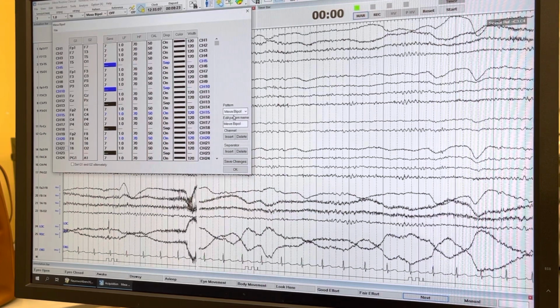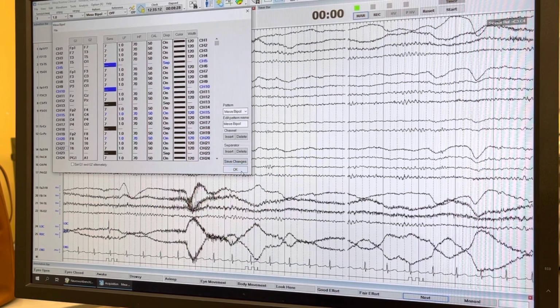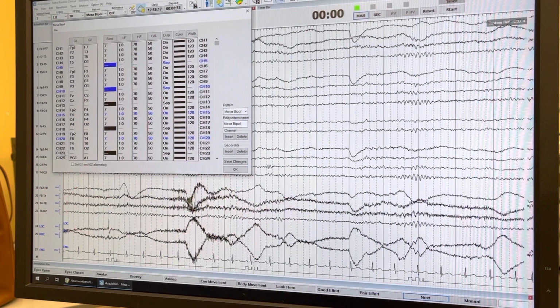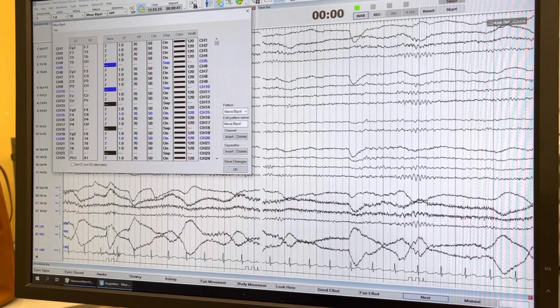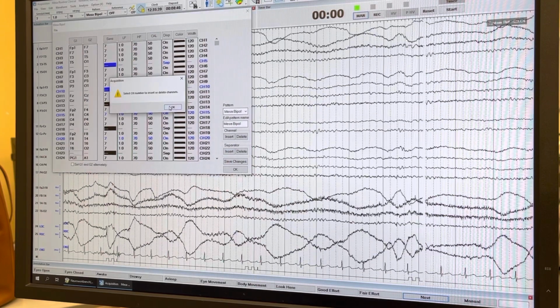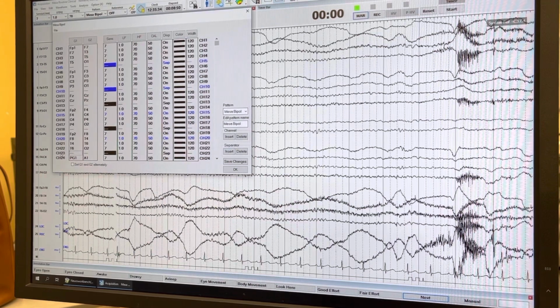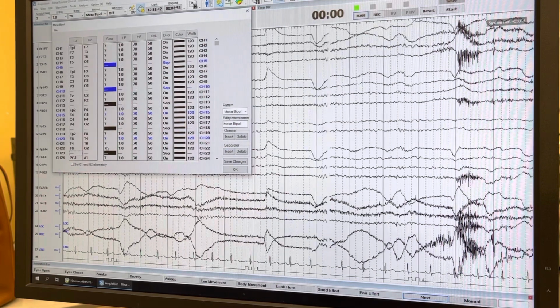Is that right? Did she tell me that? I'll have to look that up. Let's just add a space in here. We're going to insert a separator. Let's say right here. Select the number, insert.